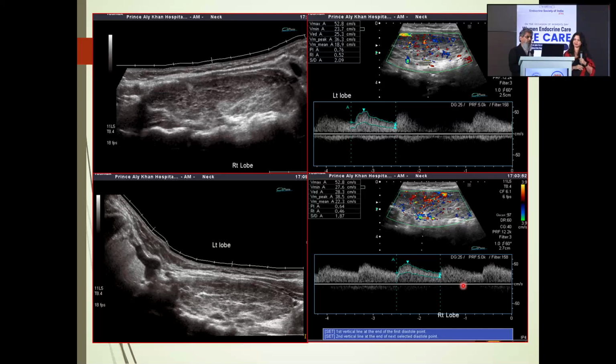We tend to see a lot of cancers, even PTC or lymphomas, with background thyroiditis, and we tend to pick it up. Generally, we see a very heterogeneous thyroid, and we would take vascularity for one reason: thyroiditis at some point may have similar features to Graves, where the vascularity would be very high. So this is one important point: the size, the overall background echotexture, how it looks, and the vascularity.